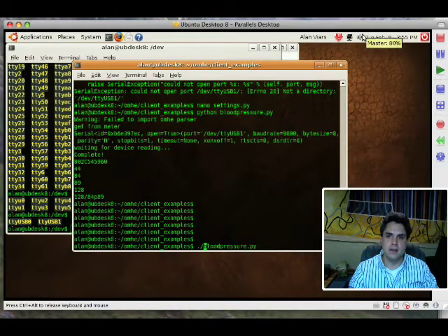Hi, I'm Alan Byers from Videntity, and in this screencast I'm going to talk about some of the latest and greatest things we're doing around automatic blood pressure monitoring.